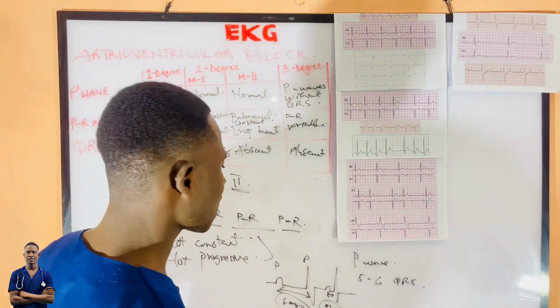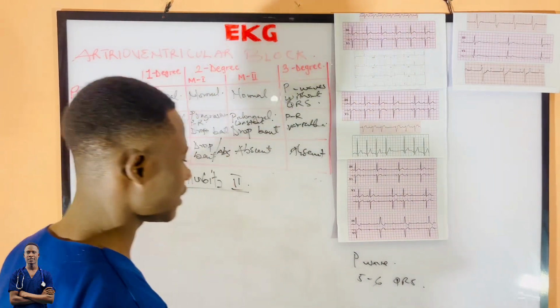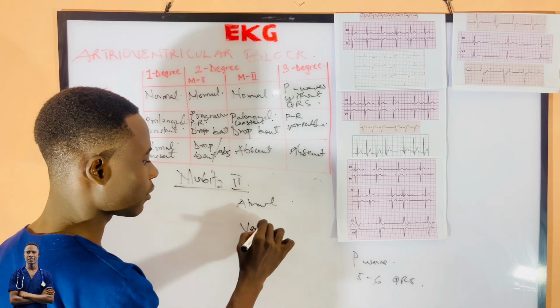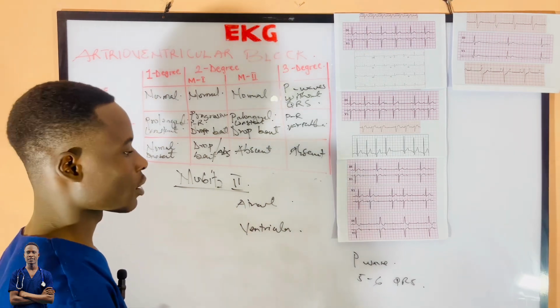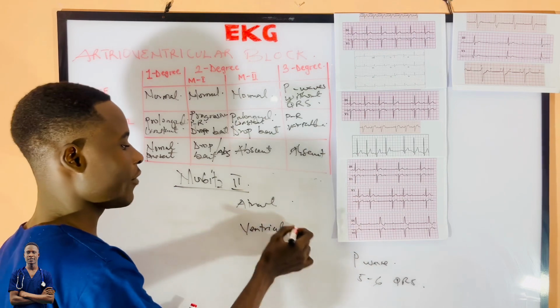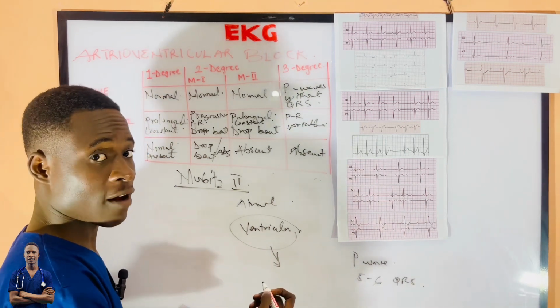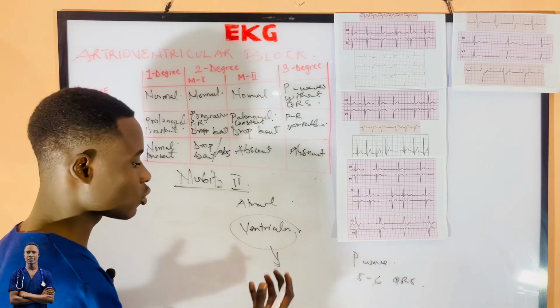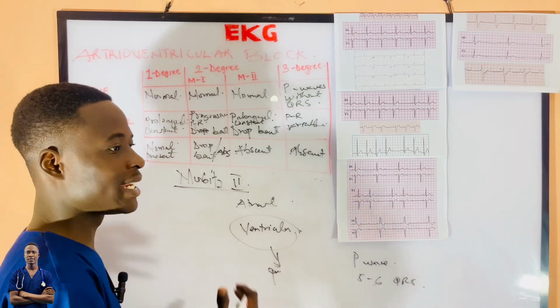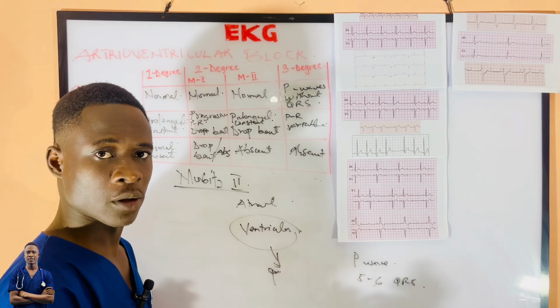And here, one thing that can also give you an idea is that there's what? Inconsistency in the atrial contraction and the ventricular contraction. Why? Because the blockage is so severe that the ventricles adapt to a new pacemaker. Do you understand? The ventricular fibers, that is the Purkinje fibers, will adapt to a new pacemaker. So our Purkinje fibers will give us a new heartbeat. And we know for the Purkinje fibers, the heartbeat that will be given is so small. Do you understand?